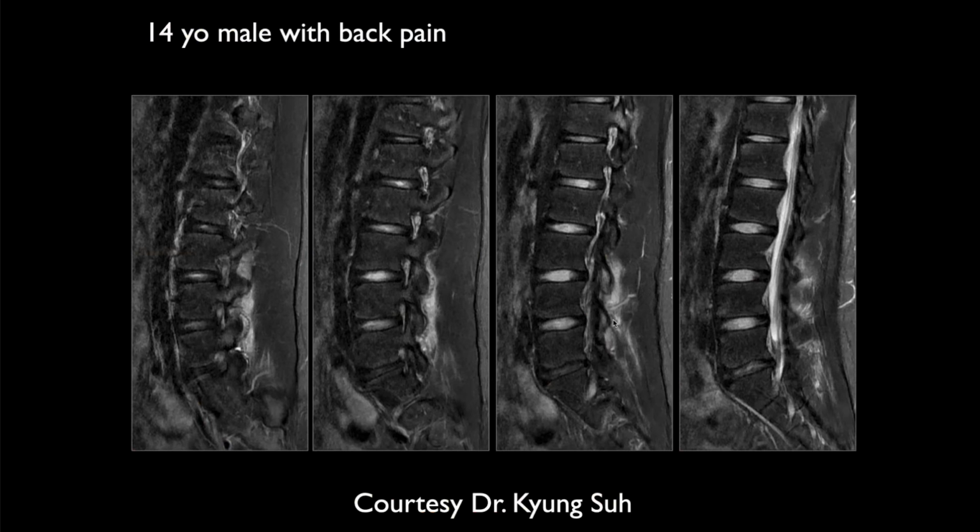So now a lot of people get concerned. You've got degenerative disc disease here at the L5-S1 level. It's only a 14-year-old, but in a previous lecture that we gave, which you haven't seen yet, getting degenerative disc disease is not that uncommon in teenagers, especially boys, especially athletes.